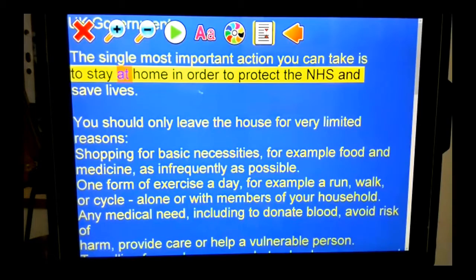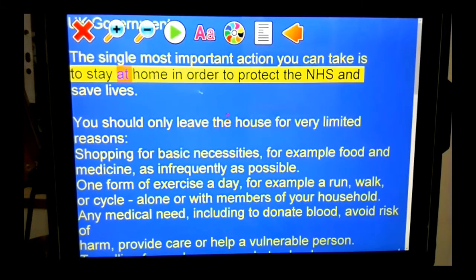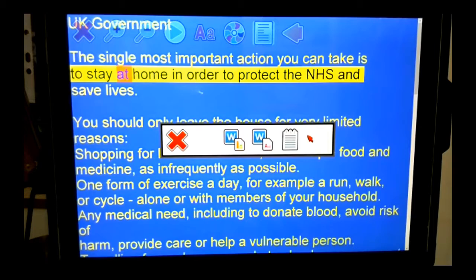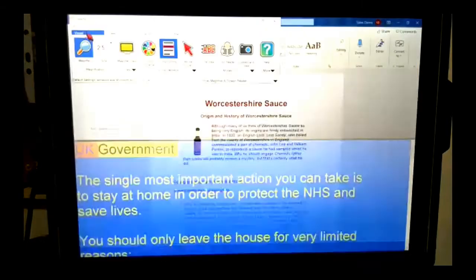If I click on the notepad and click on plus, I could turn that over. So I've got page 2, put page 2 under there, click on the camera icon, it will add page 2 to page 1 and so on. And then I could read them all back. If I click on the other icon, it will take a document from my computer and add it as well. Once I'm happy with that, I've read it back, click on the notepad, click on the export. I can now export it into Notepad, or if you've got Word or Google Docs or whatever on your device, you can put it straight into there. You can edit it, print it, attach it to an email, whatever you wish with it. So that's one part of Connect and View.